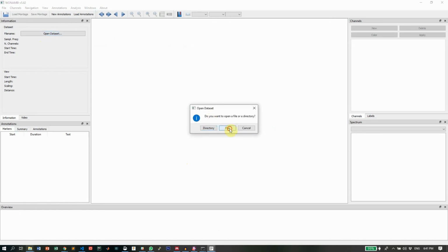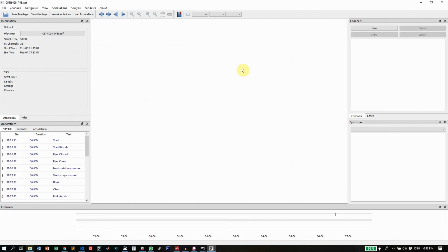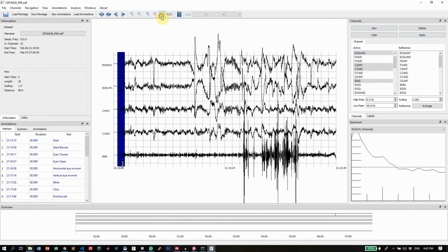Let's open one data set. Okay, let's just open this one. Okay, it's open. We have to create a new channel, and let's add C3, C4, EOG left, right, and where is EMG? EMG. So the file is open.